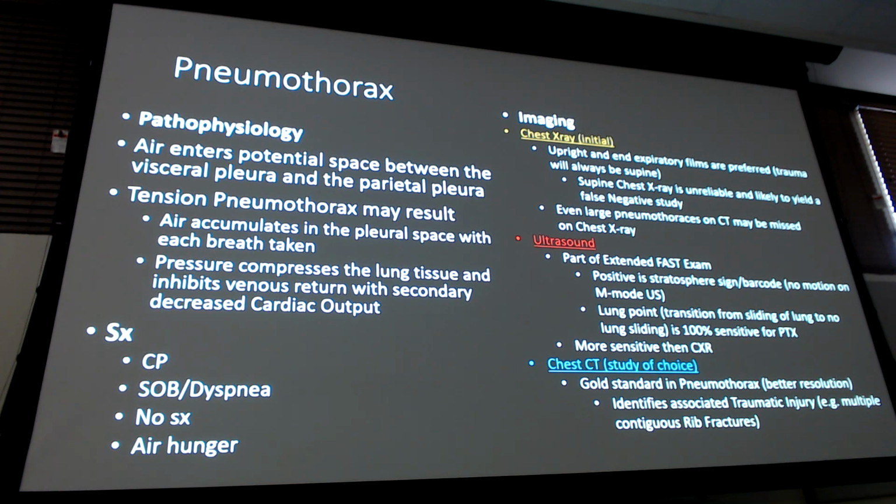Because when you breathe in, right, you have all that pressure, the lungs are pushing on that pleural space, you'll see that pneumothorax, but when you push everything out, you don't have that pressure anymore, right? All the air is out of your lungs, or most of it, so now that air in that pleural space that's not supposed to be there has more of a chance of pushing on the lungs, and it'll stand out a little bit more on that expiratory film because the pressure will be greater on the outside of the lungs. So if you ever have that patient and you're like, I really think this is pneumothorax, but the X-ray is not confident, order your expiratory films because that will help it pop a whole lot more. Okay.